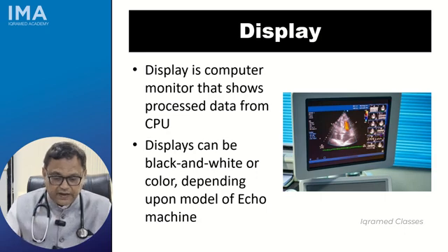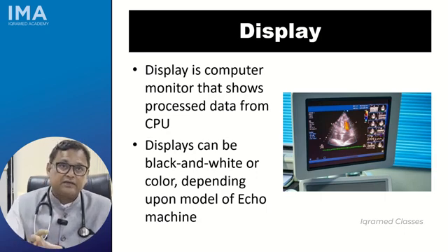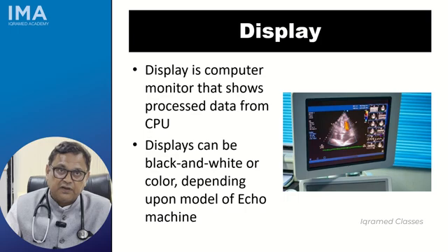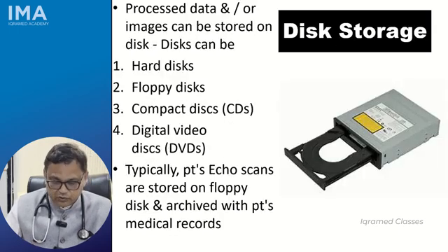Now display, I already showed you. Every screen will have a display, and it could be either a colored display or a black and white, depending on what kind of machine you have and what kind of programs you are using. It can be both ways.